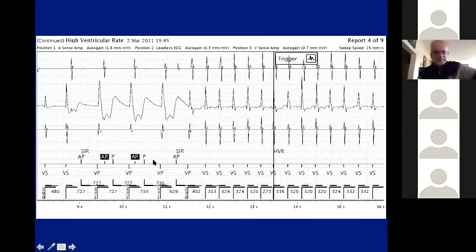And then something interesting happens. So after this A paced event, you have another V paced event, probably sinus, and then an arrhythmia starts, right? And how does it start? Starts with a PVC or with a PAC? So this is A pacing, right?